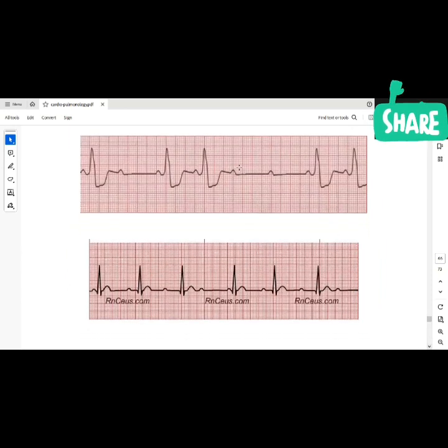So I have two ECGs. We're going to start with the one at the top, and then we'll go to the one at the bottom. So let's get the one at the top. Same thing. Read this ECG for me.